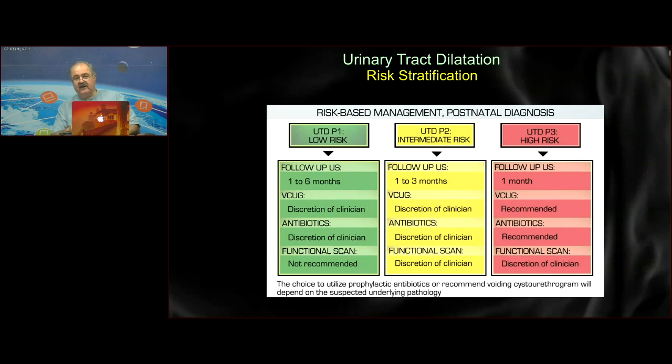We not only go by the actual value, we also go by how far it is from the median, and someday we might even come up with multiples of median. But the fact remains that if the fetal weight is on the 93rd centile, that's normal. Kidneys at 41 to 43 are relatively bulky, but that's in the normal range. I may not even mention it. I'll just say, okay, come back again at 36 weeks so that we decide whether there is a Beckwith-Wiedemann.